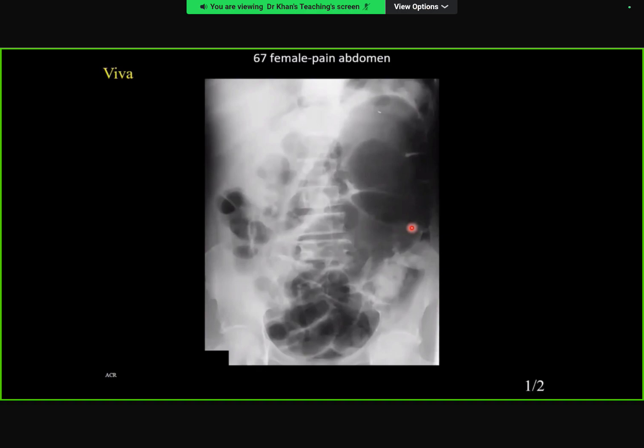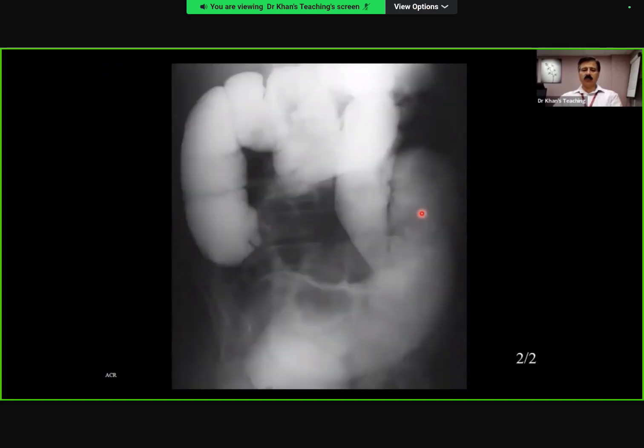The patients who have a redundant cecal mesentery, that will twist. So sometimes the cecal volvulus will sit in the left upper quadrant like this. That's a take-home. But the main point for you to remember is this haustral margin.